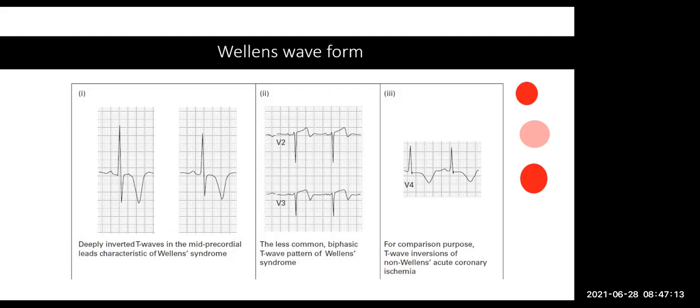One of the other reasons why I picked this is just to show you that ECGs can have some weird patterns. Now, if somebody were to just show you this and you had never heard of it, just the fact that you recognize something is wrong, I'm happy. As soon as you all said in unison, no, we're not sending this patient home with Panado, you've already done very well. You saved your patient because you are going to ask somebody. Now, that person you asked will also look at the ECG. What the hell is going on here?